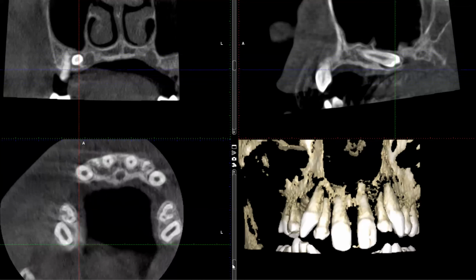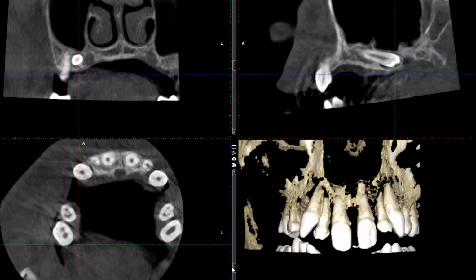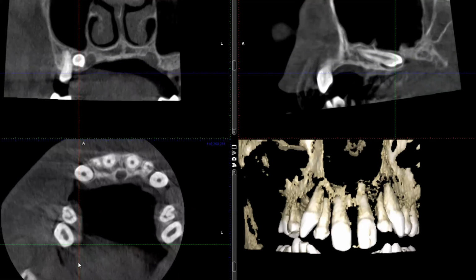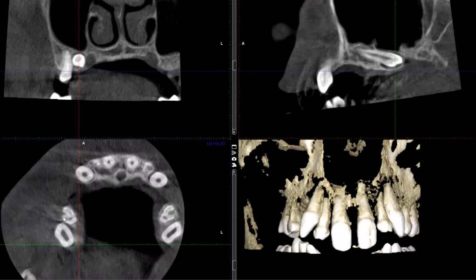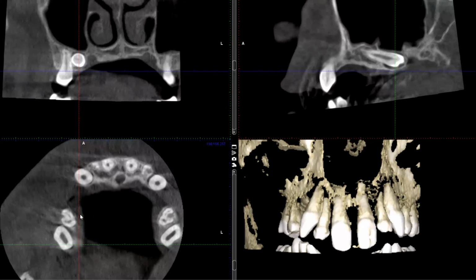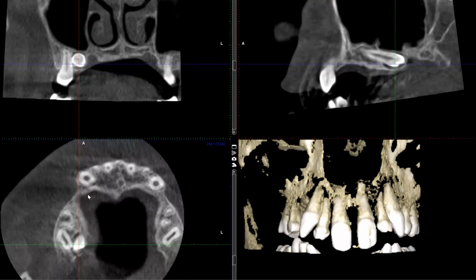But as you can see from this maxillary arch, let me help you get oriented here. What we see is permanent molars, this being number 3 and 14, and we're missing second and third molars. And then these teeth in front of it are primary molars. So these are not permanent. So we're seeing some of the retained primary teeth. And in front of these teeth, we're missing permanent premolars. So no premolars whatsoever in this area.